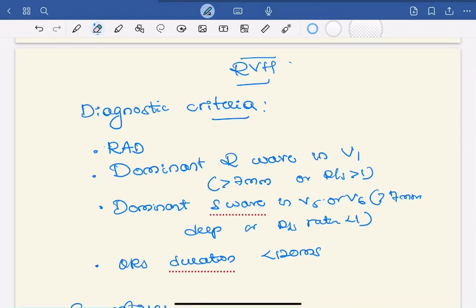Hello friends, in this video I am going to teach you how to identify right ventricular hypertrophy on ECG. There are diagnostic criteria to identify RVH on ECG. First one is there has to be presence of right axis deviation.